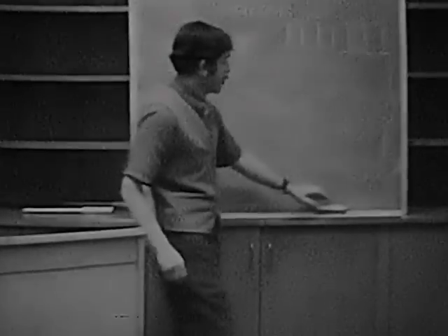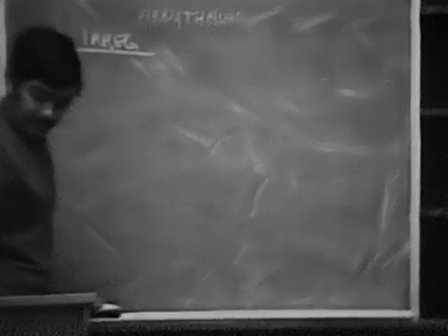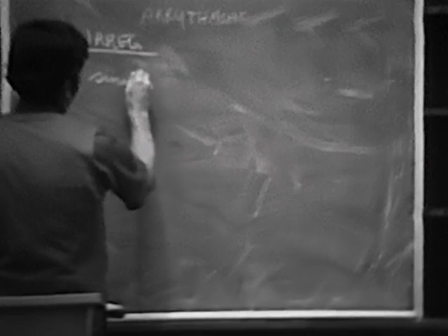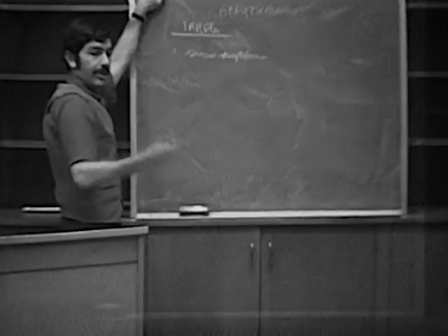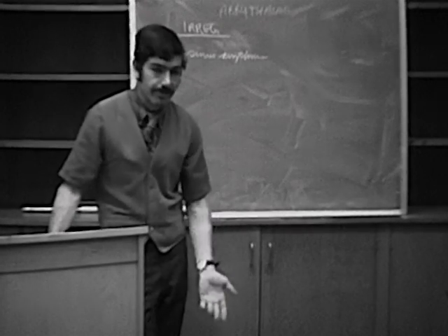Now, irregular. Let's talk about irregular atrial rhythms now. We'll go from the least irregular to the most irregular. And probably the least irregular is the sinus arrhythmia, as you are all aware about. I've seen many times. And that's the normal speeding up and slowing down of the heart rate with respirations. Right? As you inspire, it speeds up. As you expire, it slows down.